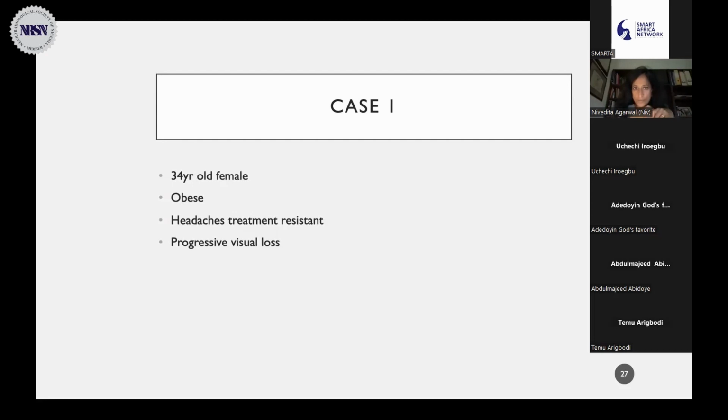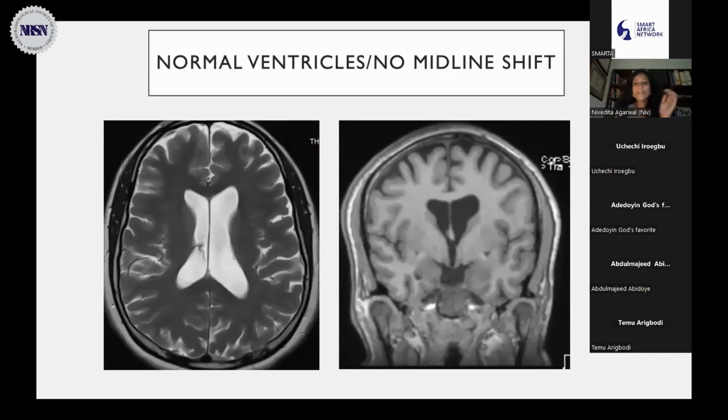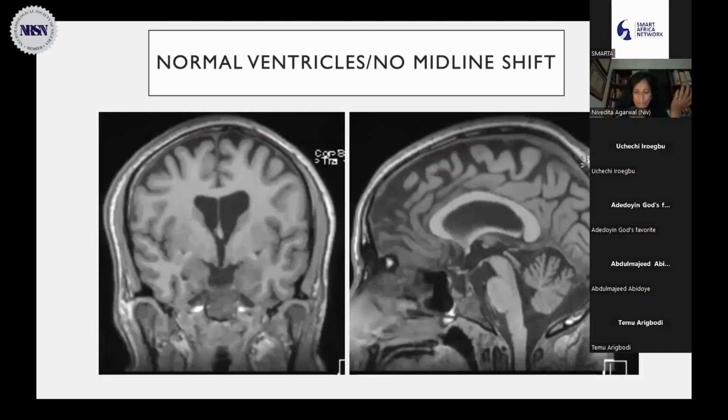And this is the patient that comes to me to do an MRI. And I'm perplexed. Why is she doing, I don't know, was it the third or the fourth time she was doing an MRI? And these are just some images of this patient. I look at this MRI, I'm like, you don't have anything. I mean, the ventricles are fine. Great sulci, you have a good brain parenchyma. I can't see tumors, I can't see edema, I can't see white matter hyperintensities. The skull looks great. The sagittal, probably there are a lot of cisternal spaces, a little bit big, but you know what's normal.